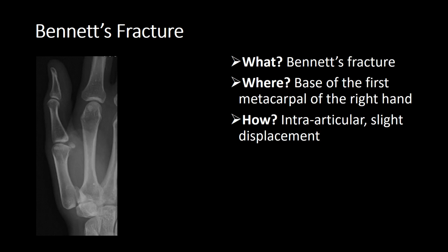So what is it? It's a Bennett's fracture, where it's the base of the first metacarpal of the right hand, and how? It's intra-articular, very important to comment on that, and there's slight displacement.